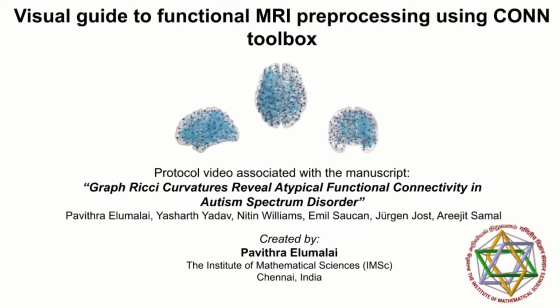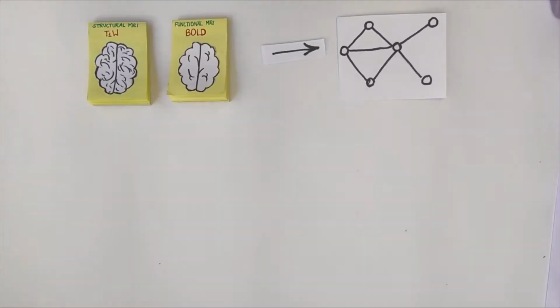This video is a supporting information of the paper that you see on the screen. Demonstration of how we preprocessed functional MRI images into functional connectivity networks that we analyzed in our paper.